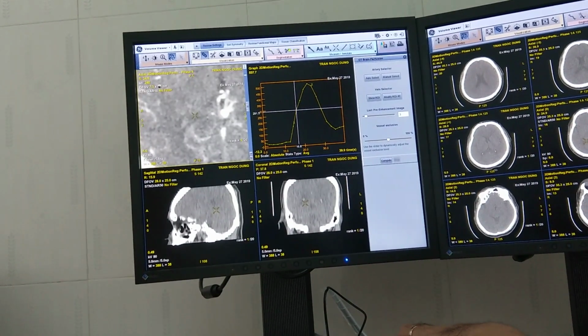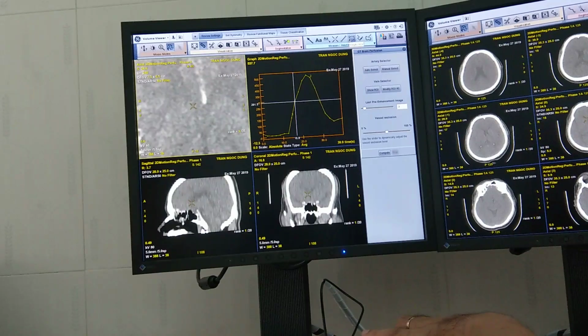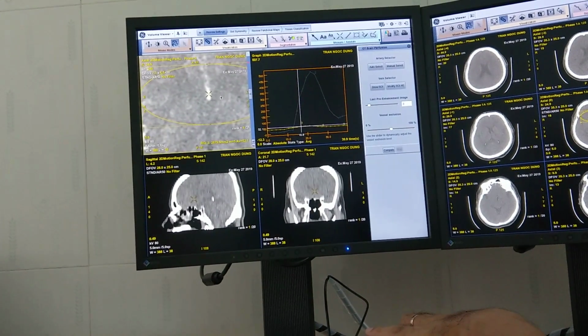So I just go. I can put an ROI. Put it here. Oh, sorry.